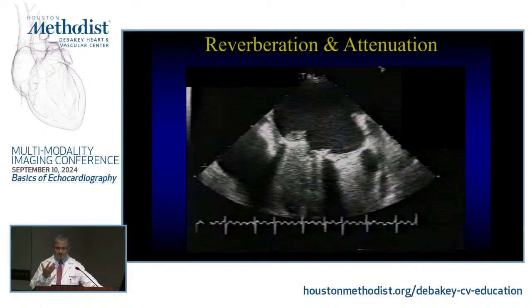Take an example. I have a prosthetic valve in the aortic position or in the mitral position. In the mitral position, I can see flow coming through the ventricle. I can't see much going on in the atrium itself. So I do a transesophageal. I emphasize the reverse of such. Okay? So it depends on where the reflecting structure is and what's happening behind it.